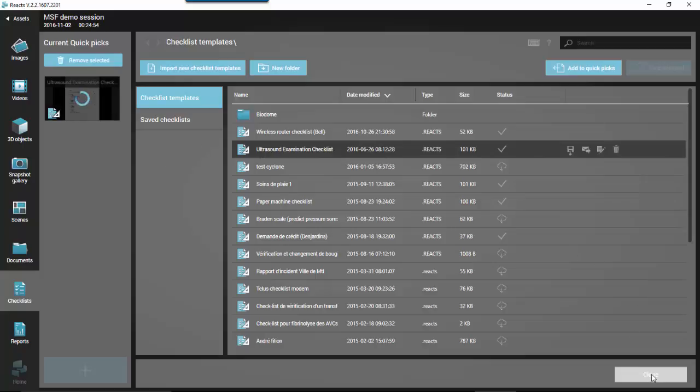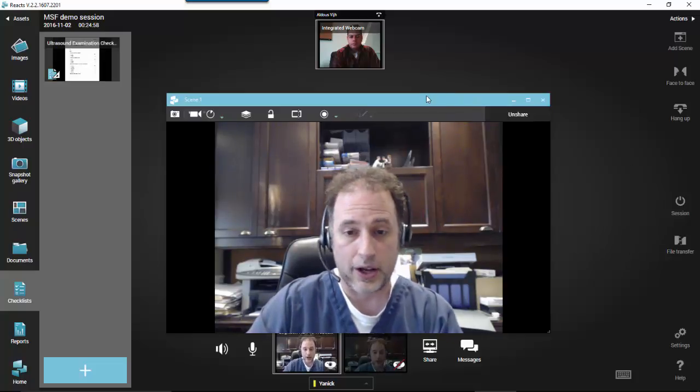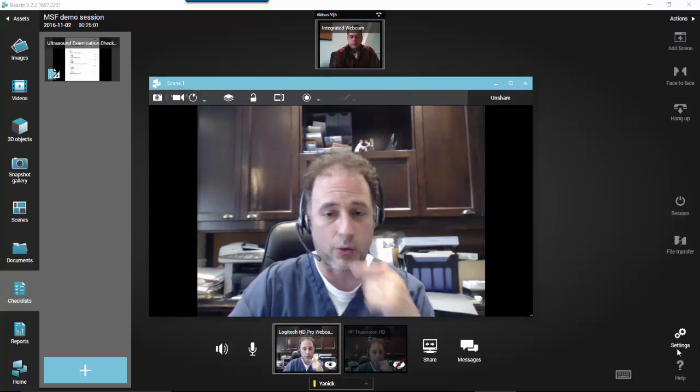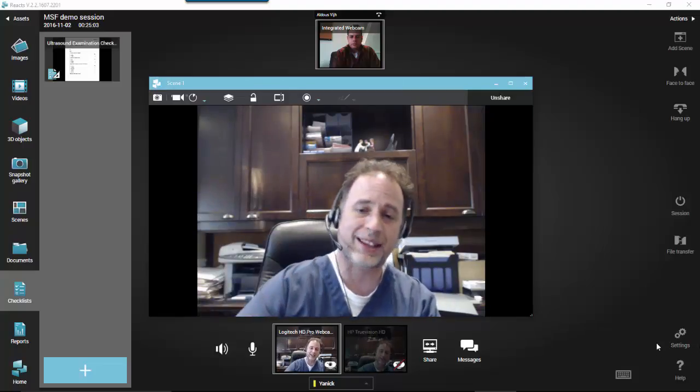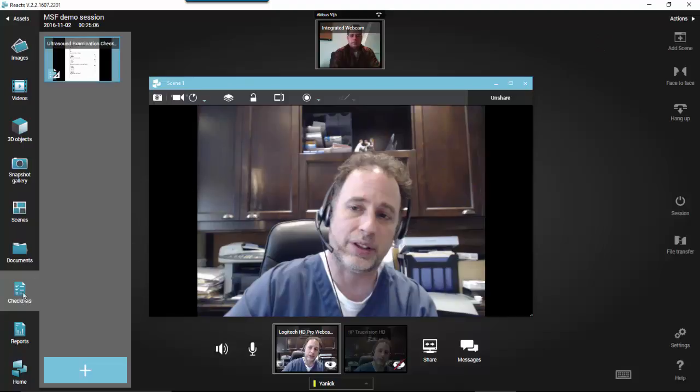So this could be anything. It could be a wound checklist. It could be a report that you're doing for an exam. It could be a report, a very standardized format. So once your checklist is here, you drag and drop it on your Reacts background.